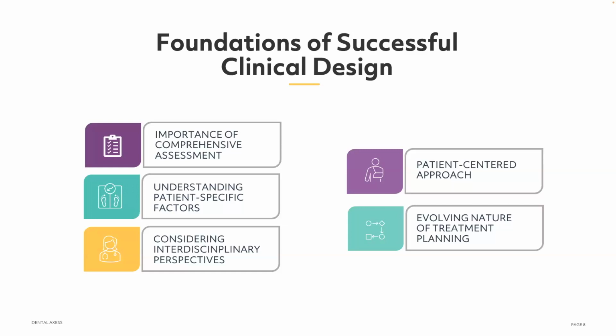So we need to reevaluate the treatment plan, make refinements, change attachments, everything that we need to do to achieve the correct results, even if we need to change it during the process or have a refinement or modification. One of the important things here is the fact that we can have all in one place, all this information, all the refinement cases, all the patient information in just one place, to avoid confusion or delays, and to have good documentation of our process.